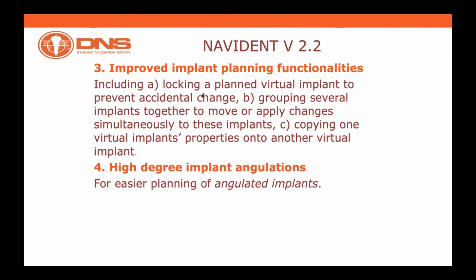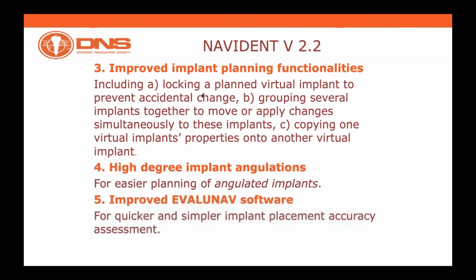We will talk as well about the opportunity with version 2.2 of angulating implants at some unusual angles. So for those who are using Navident in endo, for example, and they need to do some apicoectomies or activities that are linked to angulation higher than the standard vertical position of implants, they will enjoy this feature very much. And that's something, again, we will dwell upon.